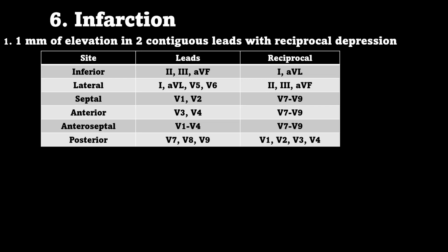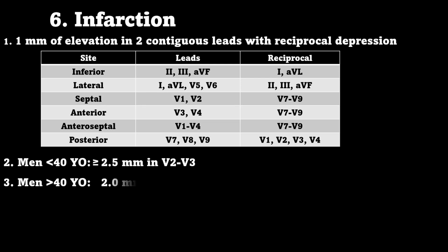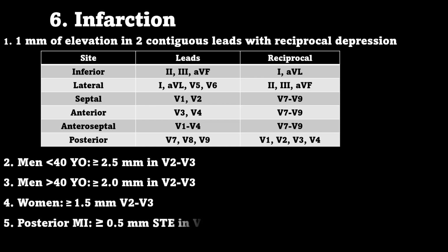But unfortunately, nothing in life, and especially medicine, is simple, so you do have more criteria that you have to remember, especially if you're in school. And here it is for your men and your women and your ages. The big one I want you to take away from this is your posterior MI.